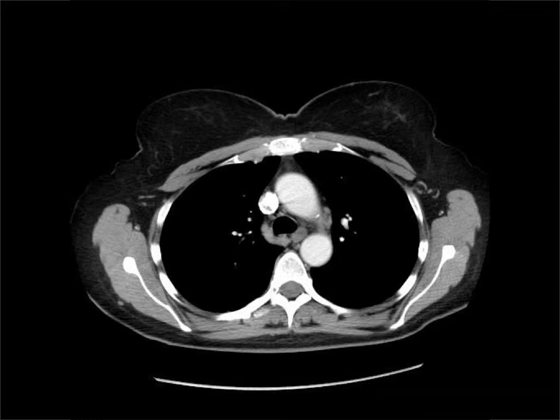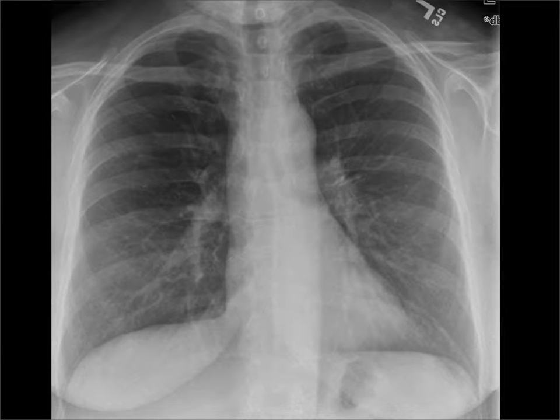Now, what lives in that space? Well, we've got the azygos vein itself, and then we have at least one of these little grey oval things, i.e. a lymph node. There's a normal azygos lymph node. Now, generally speaking, the azygos vein shouldn't be more than about 1 centimetre across in its short axis there. So what can enlarge it?